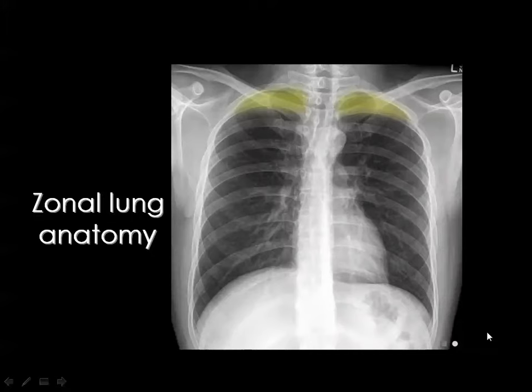And if you have a pathology in the lung and you want to locate it in a specific area of the lung, you know that any radiograph shows the patient facing the physician, so this is the left side of the patient and this is the right side of the patient.